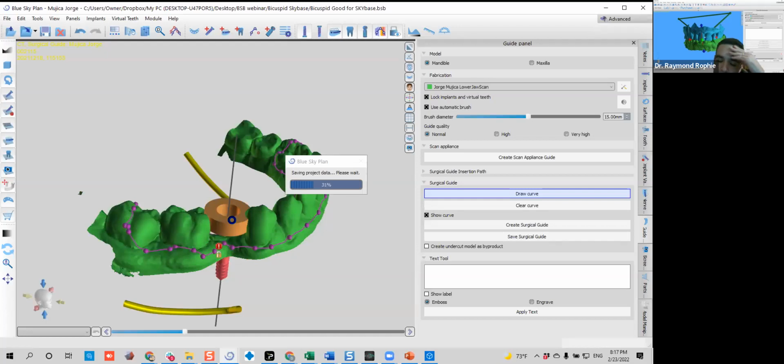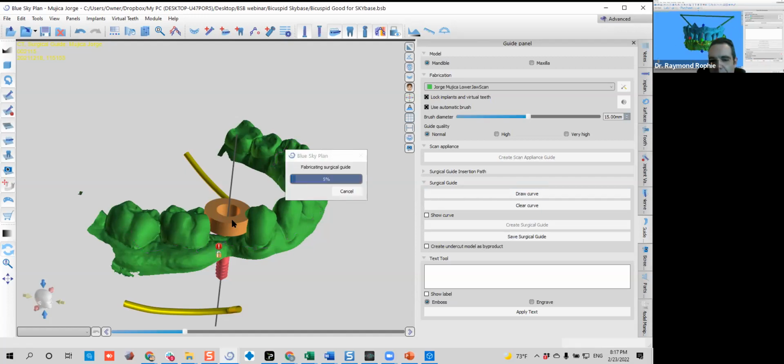If you want to create a window, then you can just add your window before or after now and create a surgical guide over that. It will give you a nice surgical guide so you can export and 3D print. But I think that this part you can definitely take advantage of watching Dr. Mickley's video, or for sure you can take these steps as well. I know that I said them fast, but just as I said before, just pause and play, and it will give you all the ideas as well, so you can follow.